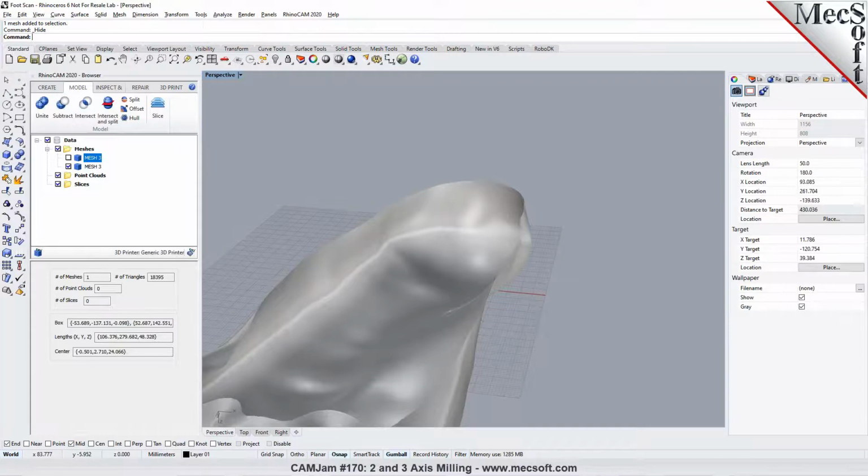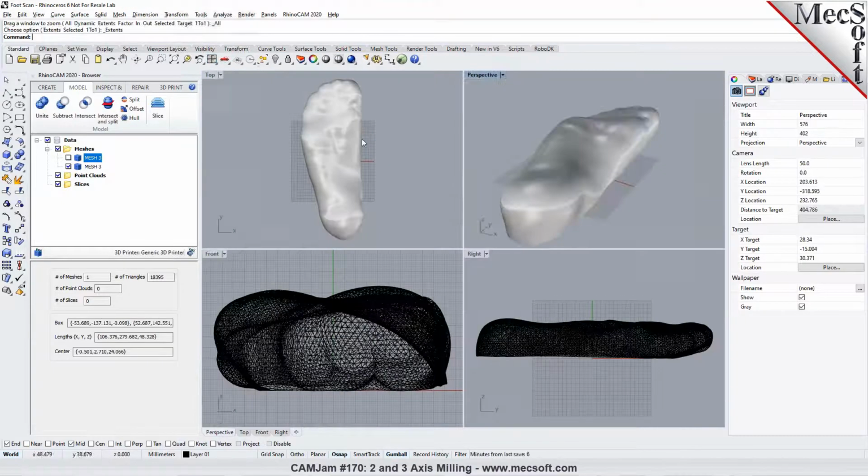There are different tools available, and there are also some additional plugins available in Rhino which you may have to look into that are specialized for your needs. RhinoCAM's mill module will help you create the G-code for machining, and the mesh module in RhinoCAM will help you do some mesh editing, like mesh trimming, mesh splitting, mesh inspection, and repair. If you want to do the offset in individual areas, then you may have to use some of the native Rhino tools, or some additional plugins that you have for Rhino.